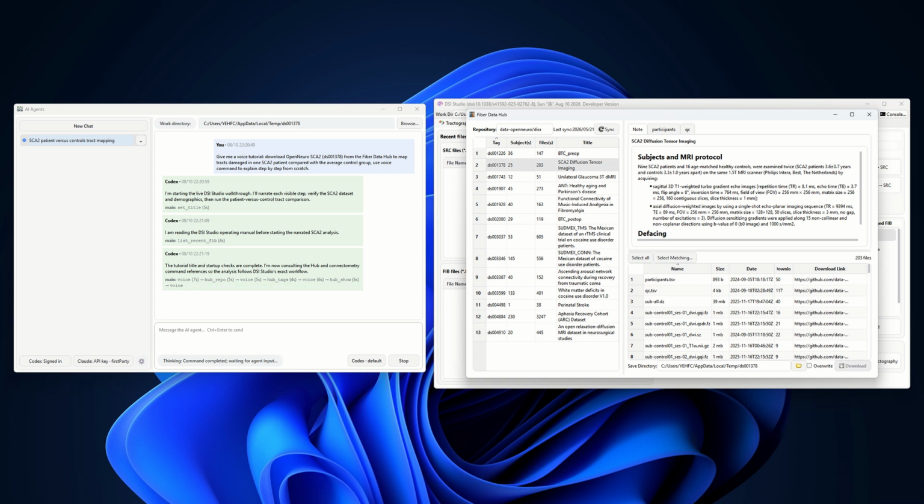This release contains 9 patients and 16 matched controls scanned twice. I will now list its downloadable reconstruction and demographics files. The empty file name filter was ignored by the launcher, so I will repeat the listing with an explicit match-all expression. The shell expanded the asterisk before DSI Studio received it. I will use an equivalent expression that contains no shell wildcard.